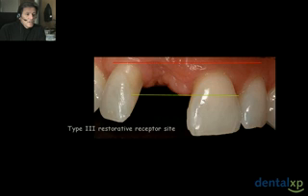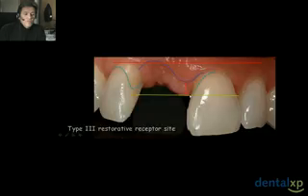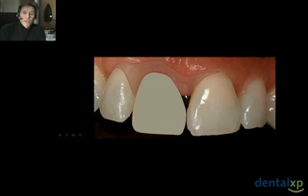And you see in the turquoise line, we'd like to rebuild the tissue in both of these areas. We'd also like to bring down the interdental tissue on the labial aspect of the central incisor. If we basically mimic the contour and proportion of the left central incisor and make a mirror image, what we're really missing is this highlighted area here in terms of the soft tissue. And that's what we'd like to achieve in this case.